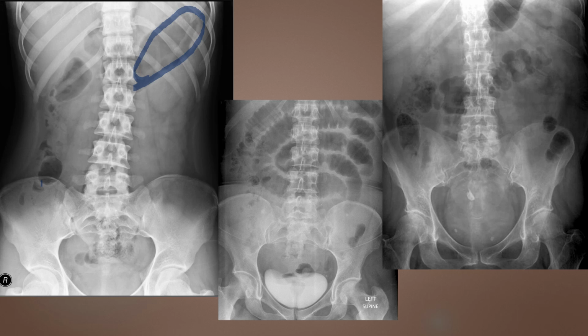So following those gas patterns, if you're really, really constipated, there's not going to be any gas in that area, but there's some bubbles here. Over here on the transverse and the descending, we don't really see a lot of stool. We don't see a lot of gas, but as you come down here into the rectal area, you see this kind of spongy appearance that would indicate that they've got some stool in their sigmoid rectal area.